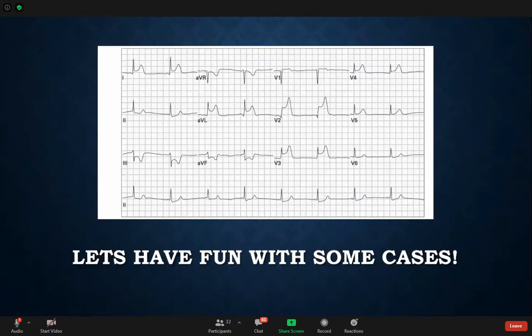Don't be afraid. Nobody wants to try to read this ECG for me? I will read it, Doctor. No. Yeah.